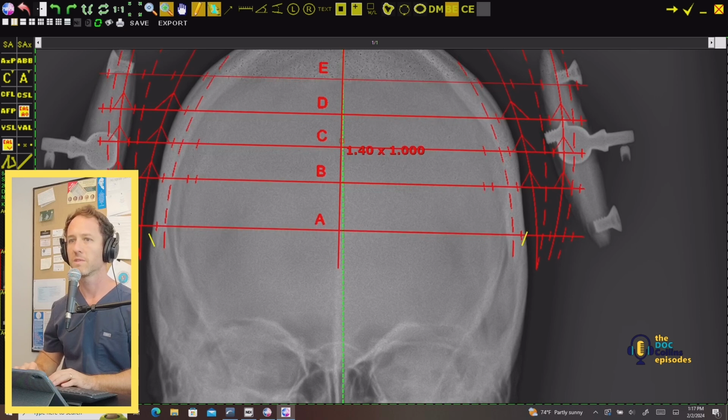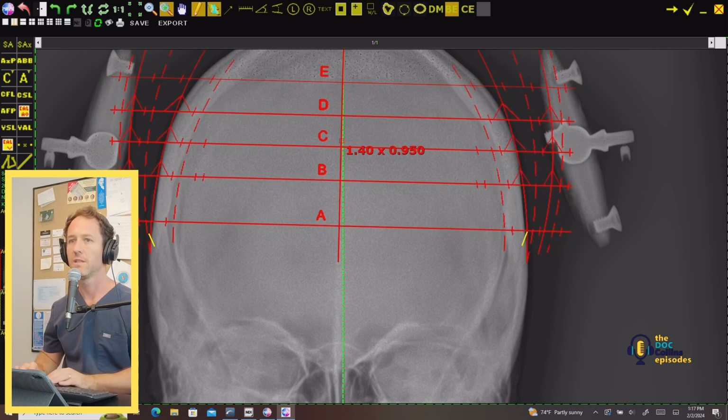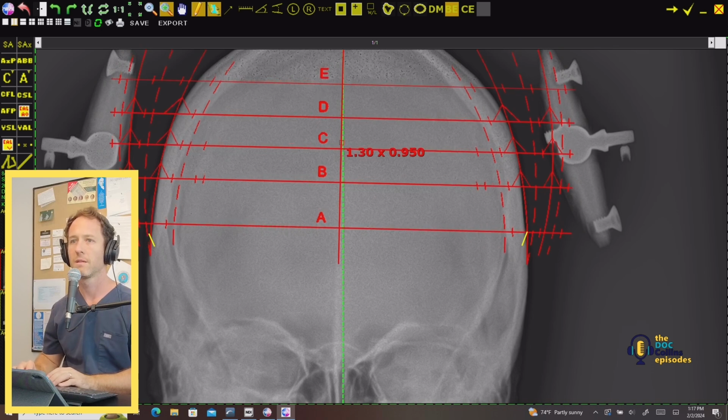But I'm looking for similar bone material, and something else I can do, depending on the shape of a skull, is even tighten that tool up. So now you'll see it's kind of hugging, and I get more of a window where I can look at that dark space to get the symmetry. And I would say this procedure in general is just an exercise in dialing it in until you're basically going back and forth, splitting hairs, and that is when it's right.